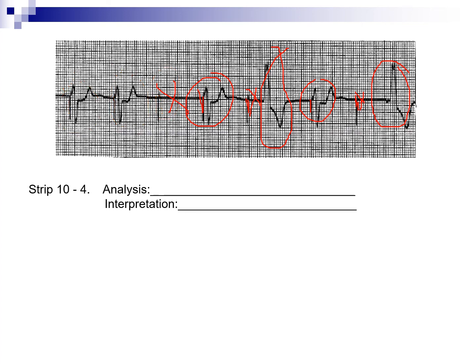So let's get rid of some of all this nonsense and let's look at how it's sensing. When you're looking at your sensing, you're looking at, is the pacer sensing that the patient has their own rhythm? So you would measure between pacer to pacer, what the pacer rate is from here to here. Then look at, so the patient's own beat came in. From the patient's own beat to the next pacer spike would equal the same as this. So this pacer came in right on time, seeing the patient's own beat, and it was sensed appropriately and fired.